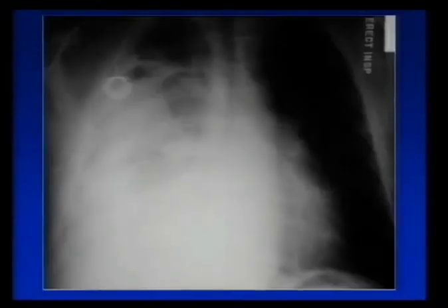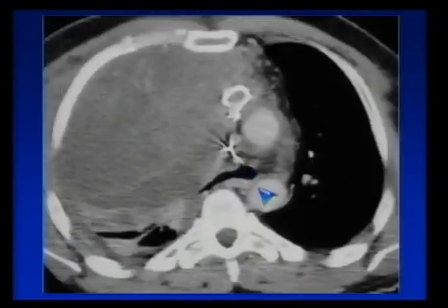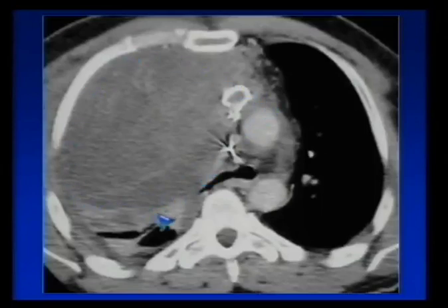Okay, this is not a very good image, is it? Well, I'm not talking about the quality, but not a very good thing for this patient to have. This turns out to be a gigantic mass in a 30-year-old. And if you look on the CT, look at this huge heterogeneous mass. It actually contains calcification. This is a non-seminomatous germ cell tumor. It's malignant and huge, invasive, and irregularly marginated. It compresses the bronchus.